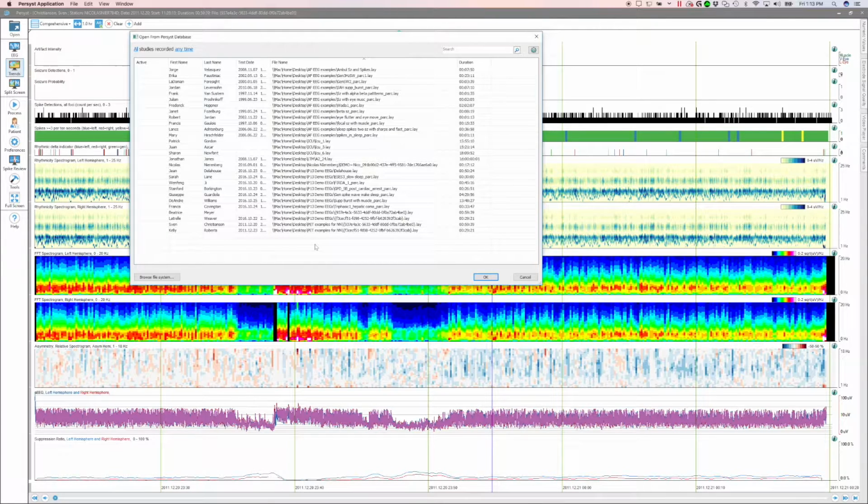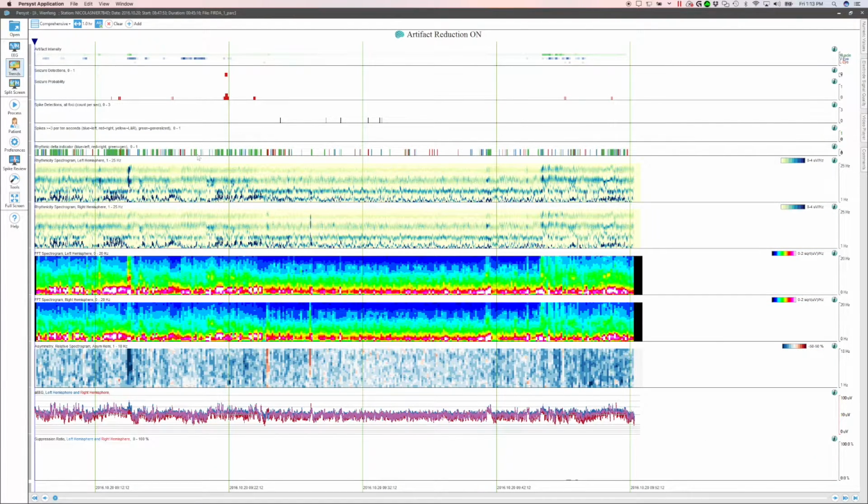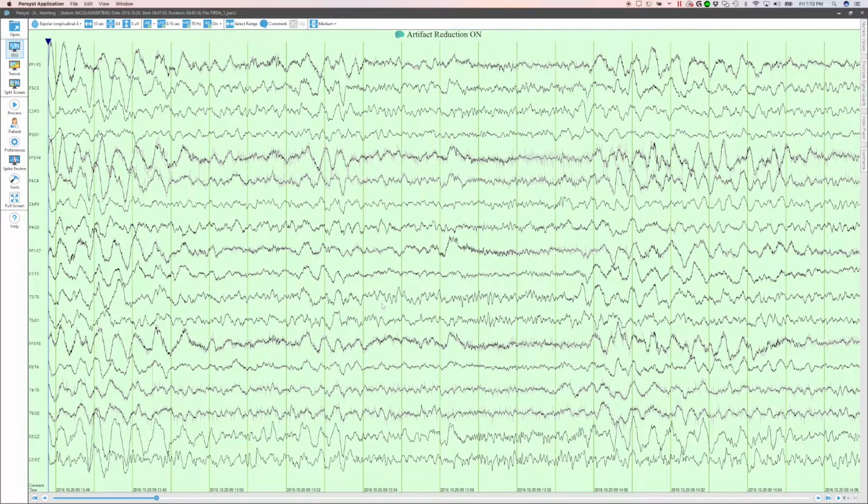Now I'll open a FIRDA case, and we've actually included a Rhythmic Delta capability, and so we can see when that is occurring. We can go to the EEG and see the Rhythmic Delta. So the Rhythmic Delta indicator is another one of the trends that is giving you some of the answers about the record directly from the trends.